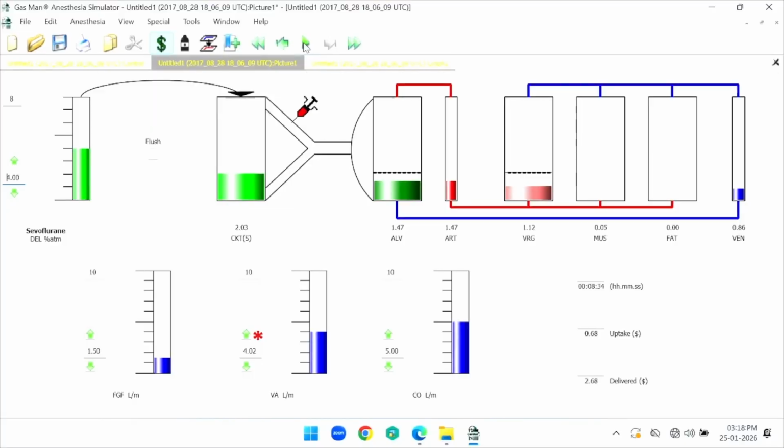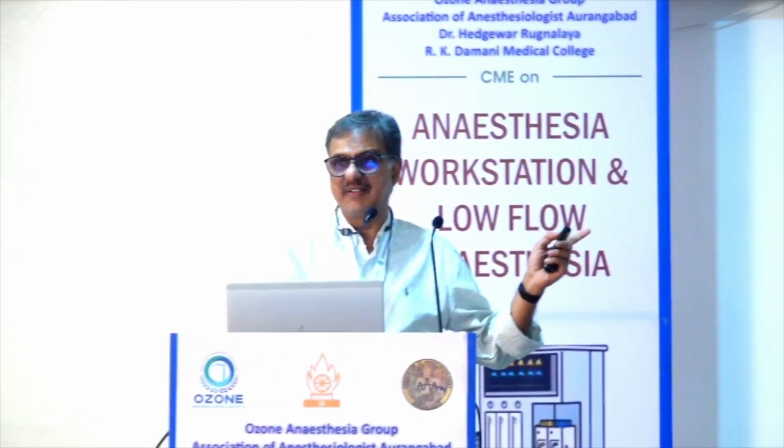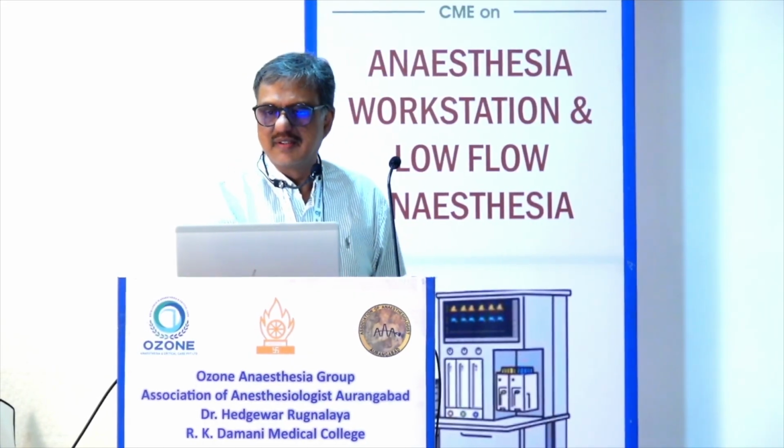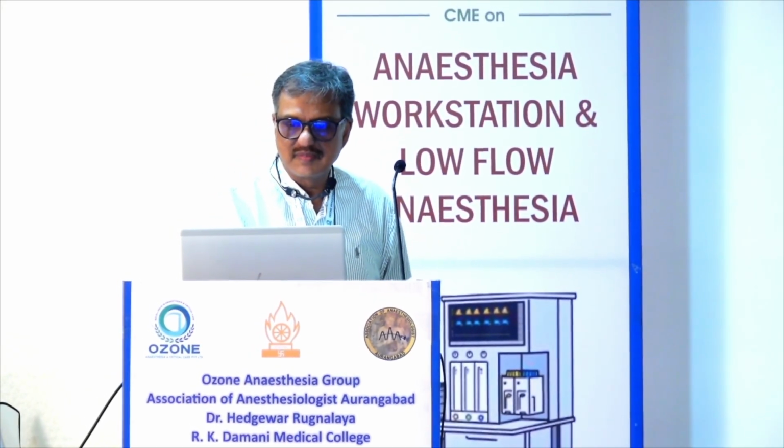That's very important. Should I run it again? I am running it again, so we'll know the exact time. Now, tell your experience in what time frame. We'll check when it is. No, not brain, at that point we have achieved alveolar. By 11 minutes 38 seconds, we'll be able to reach the target concentration. You are monitoring through the agent monitoring, but those who do not have a monitor, look at this. You need 10 minutes of 4% with 1.5 liter to get your target.